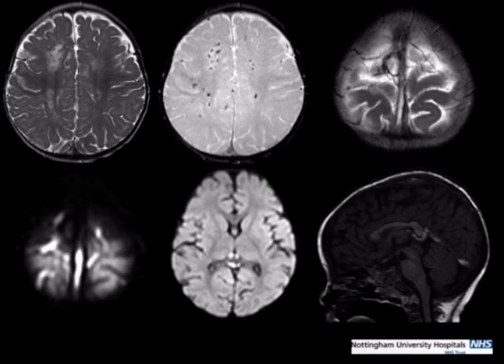This is another difficult case without careful review of the imaging. Another toddler with seizures. You've got these abnormal areas of signal intensity in the centrum semiovale with spotty low signal on the gradient echo imaging this time. Not really sure what's going on, so you have a look up and you can see on the T2 this hyperintense signal in the superior sagittal sinus, which helpfully stands out like a light bulb on the DWI with extension into the cortical veins and also the internal cerebral veins.